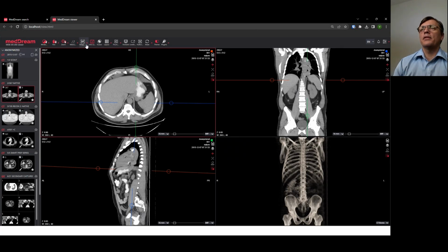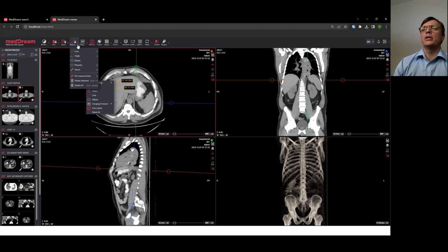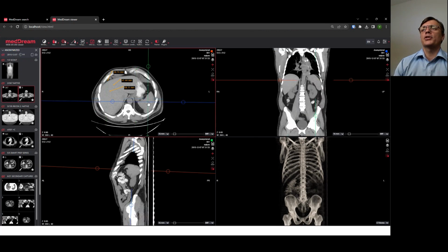So this again is the pin measurement. You see I can do a pin measurement, and after I did the pin measurement I can select the measurement and it's repeated. If I don't need this pin anymore, I unpin, and I do it once again, and next time the function no longer appears on my screen and does not disturb me.